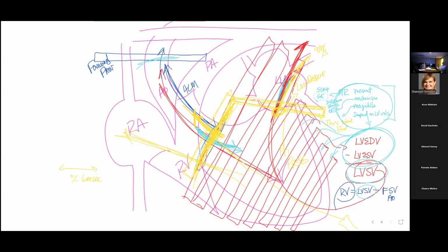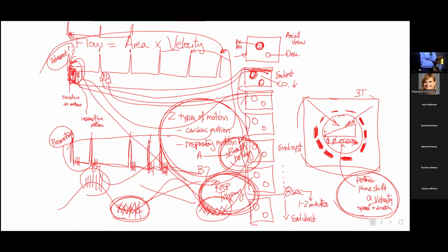So in summary, today, we have a very nice, elegant technique to measure blood flow, because flow is equal to area times velocity. And to do that, we're going to dive into the world that we used to do the cine imaging. Remember, we got to make a movie of this stuff. See over here, this nice long line, right?